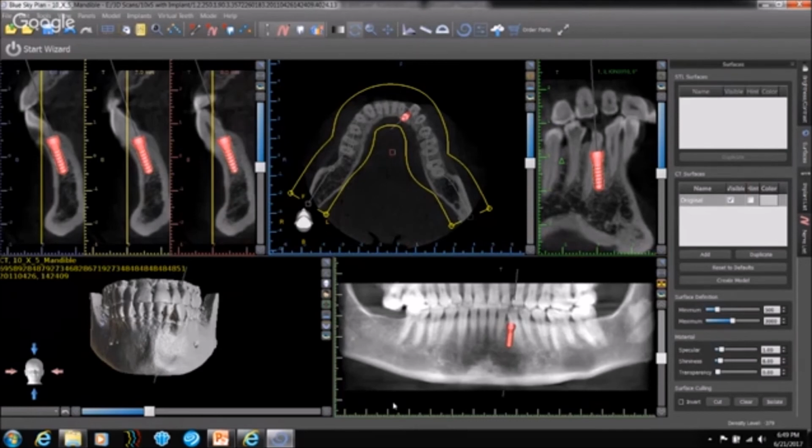You look for the cortical borders, which is the round-shaped structure that you see, just like over here, and that's the same criteria that you use. You would look for that, and if it happens to be continuous, you just follow until it ends. Most of the time, it has a dead end within the cancellous bone itself and does not form a foramen. Sometimes it does form a foramen.